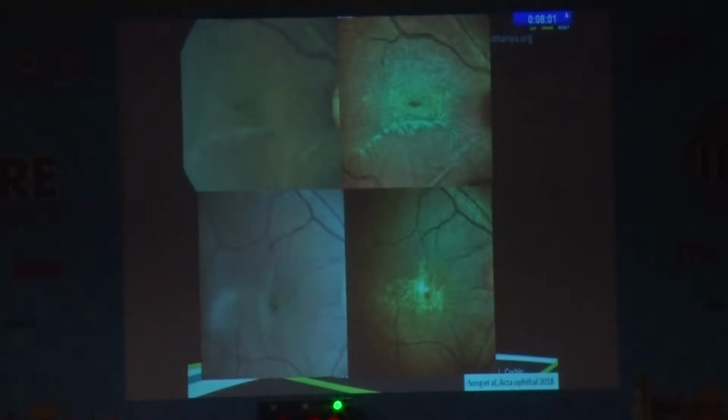These are patients with epiretinal membranes. You can see on the right side is an image with the multicolor. You can see the greenish tinge of the epiretinal membrane. The extent of the epiretinal membrane is well seen. You can also see the surrounding ILM folds. So as you can see here, it's very obvious that for these surface disorders, multicolor imaging is superior to fundus photography.